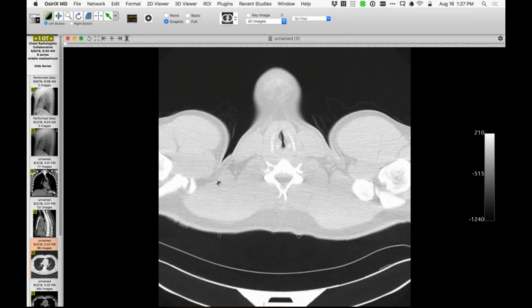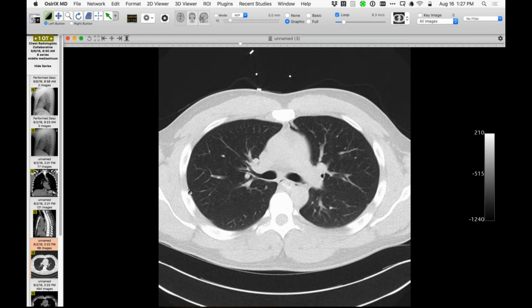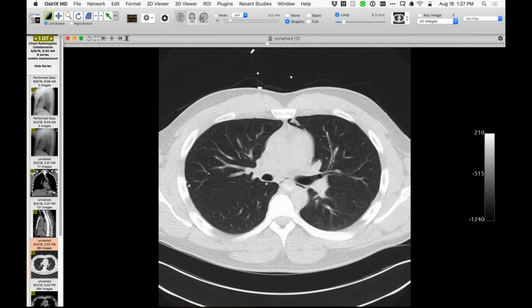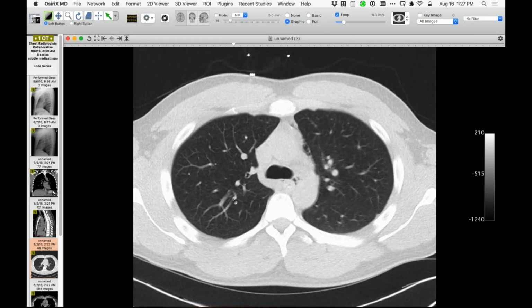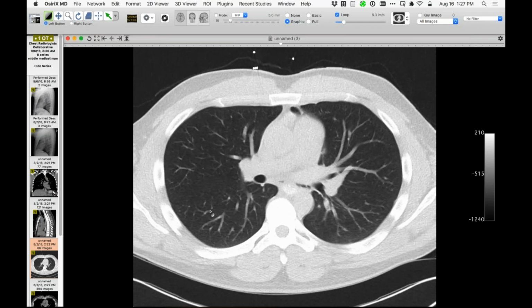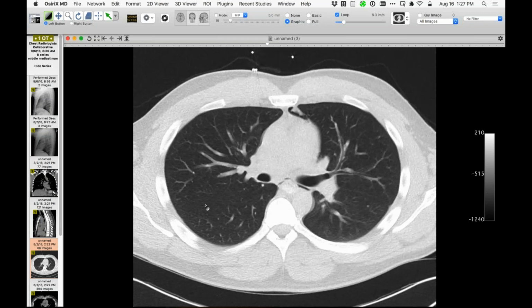So he did get imaged with CT, and you'll see, of course, we confirm that he does have pneumomediastinum. It's a modest amount, and you can see, at least at this time, there's a little about the heart, and there's a little bit here in the mediastinum. What I did look for were signs of interstitial emphysema, like septal emphysema, or air within the peribronchovascular connective tissue sheaths, to even be more sure of the diagnosis. He doesn't have it, I think. He obviously had it at some point, but it's not there anymore.